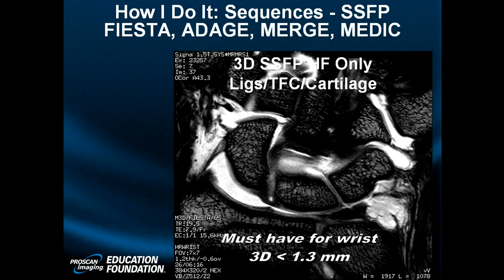For a finger, 4. How high? 10 or 12. Going much above 12, you're probably not getting good enough resolution. So look at the radial collateral ligament, the scapholunate ligament, the oft perforated, normally fibrillated LT ligament. Yes, there is an abnormality, but I am showing it for the quality of the image.